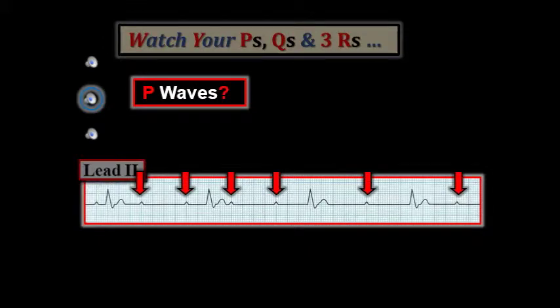Even though we can't quite see atrial activity as well as we would like in all parts of the tracing, the overall regularity of the P waves we do see, plus the suggestion of notching within the ST segments highlighted by the white arrows, suggests that the atrial rhythm is indeed regular throughout.